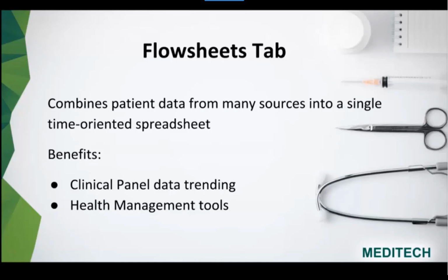Flowsheets combine patient data from many sources into a single time-oriented flowsheet. These panels are oriented towards systemic evaluation, condition monitoring, differential diagnosis, and intensive care monitoring. The Flowsheet tab is always active regardless of what data might exist.